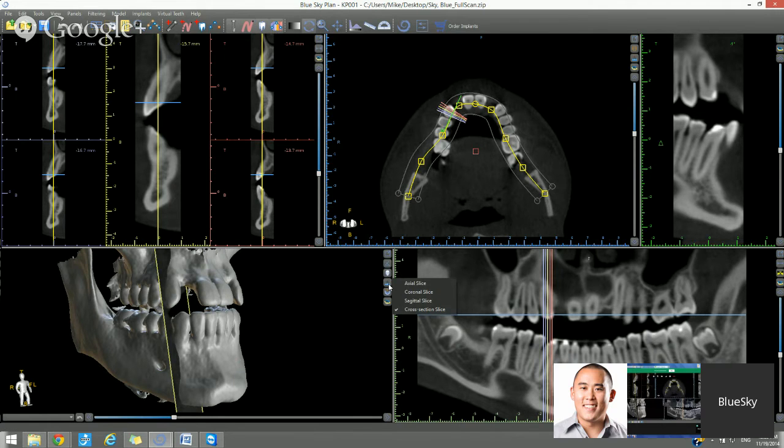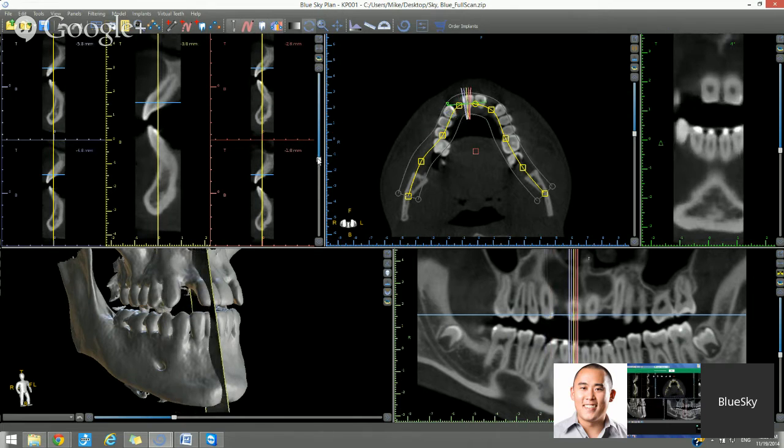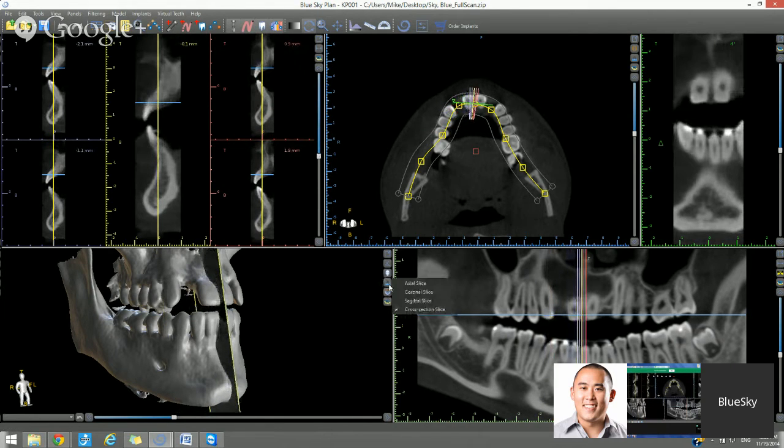The fourth button here allows you to show which indicators are visible in the 3D view. Right now we have the cross-section indicator. So as we run through the cross-section slices, we can see the indicator moving, and we could turn that off and operate the software without it as well. The bottom button, again, is our screenshot button to add the screenshots to the basket.